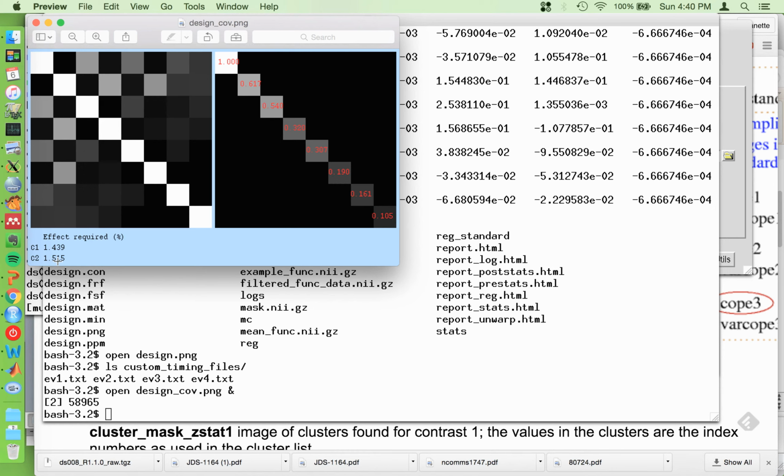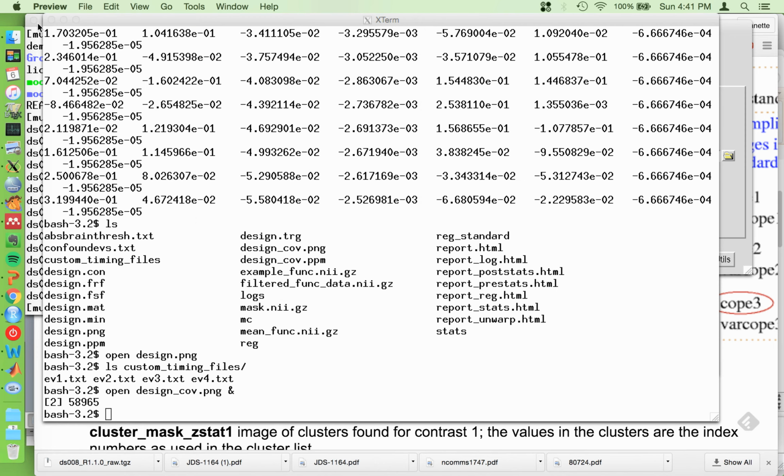Just ignore this. Maybe someday I'll do a thing on calculating percent signal change and why I have a little bit of issue with how this is done, because it uses the regressor height in the computation, and I don't find the regressor height to be very interpretable, especially in a design like this, a stop signal task, because you can have some subjects with tons of go or with tons of successful stops and some with very few. And anyway, we'll get there. But the rest of this is helpful.